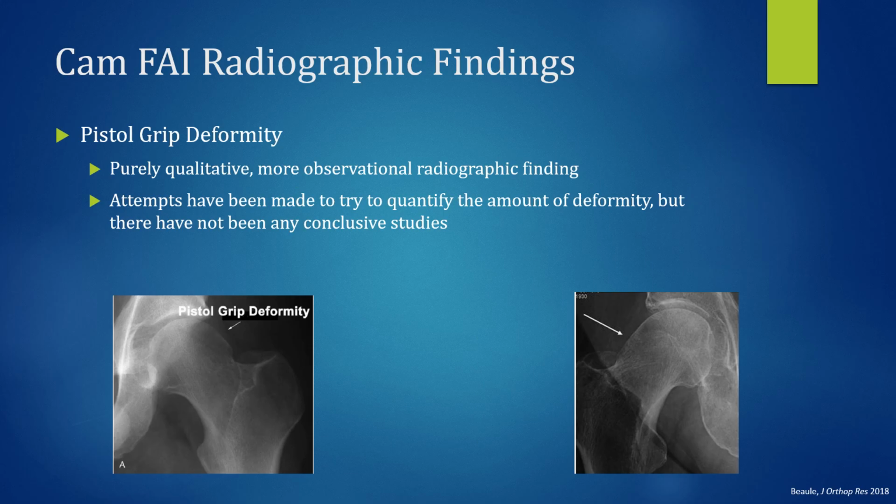Keep in mind that the pistol grip deformity is purely qualitative and is more of an observation when looking at an AP pelvis X-ray. Some studies have attempted to quantify the amount of pistol grip deformity, but there have been too many challenges to come to a decisive conclusion.